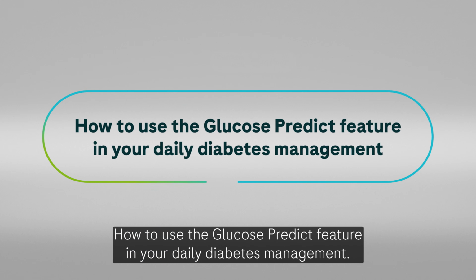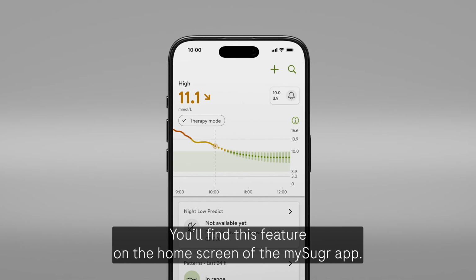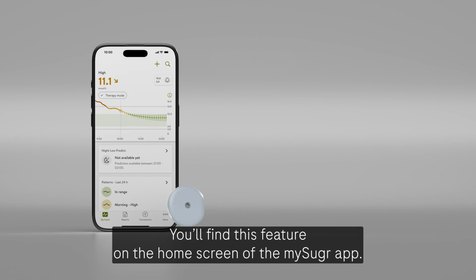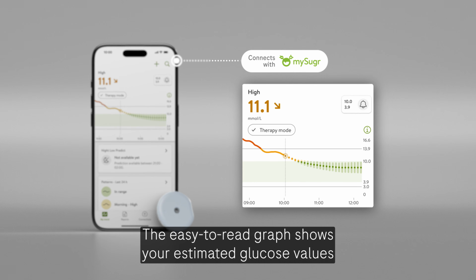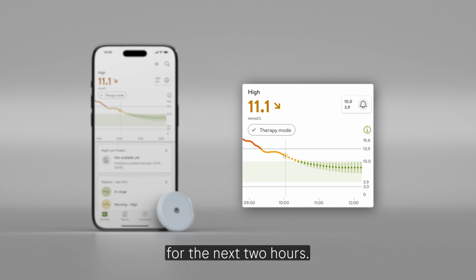How to use the Glucose Predict feature in your daily diabetes management. You'll find this feature on the home screen of the mySugr app. The easy-to-read graph shows your estimated glucose values for the next 2 hours.